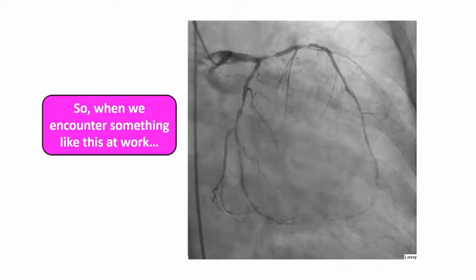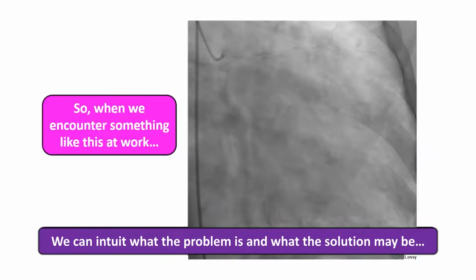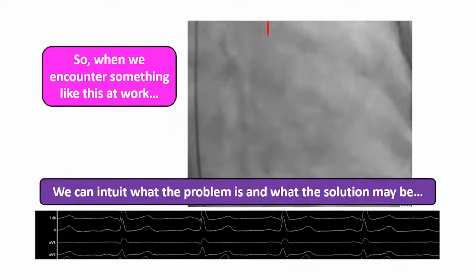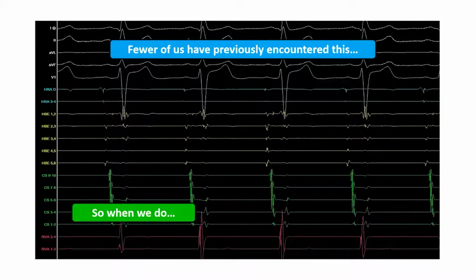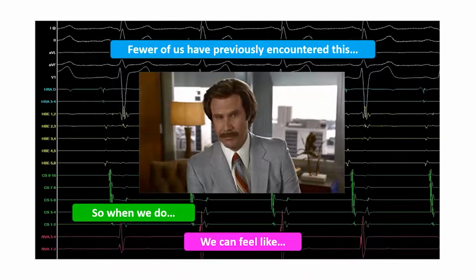So, as a cardiology fellow, when you encounter something like this at work, we can intuit what the problem is and what the solution may be. But fewer of us have encountered something that looks like this. Now, this is just a simple screenshot from our electrogram monitor. So, when we do encounter something like this for the first time, we can feel a bit confused.